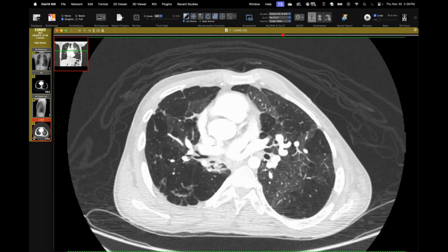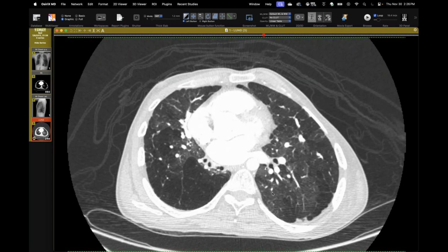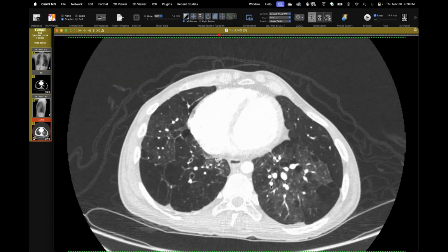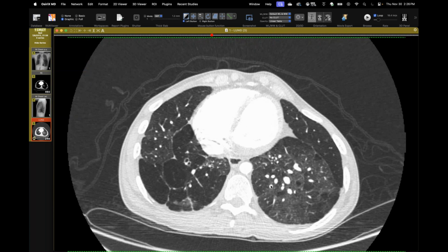The lung develops normally, but then gets injured early on in life and then has a bunch of problems with it. So I suspect he would be prone to maybe recurrent infections because of the bronchiectasis and air trapping, but we don't see this much anymore. I haven't, at least, but I know David's shown some in the past. But David, is this in keeping with what you've come across in your practice?